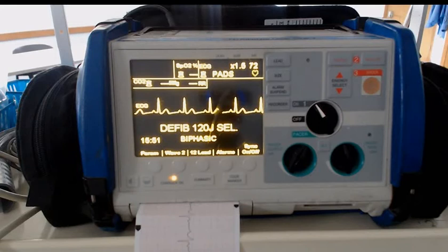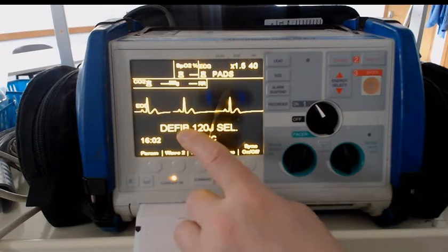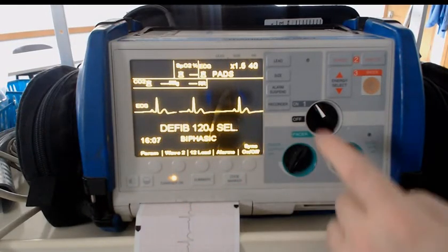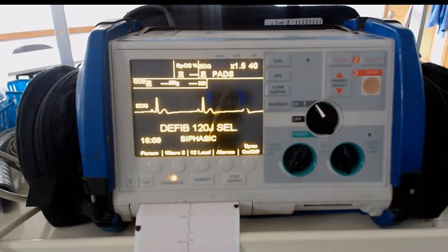As an EMT or an AEMT, you may find that you're on scene and you see a couple of other rhythms that are still interpretable. First, you may notice that the rhythm is very, very slow. It is still a sinus rhythm because we can see a P wave in front of every QRS, but it's very slow. In fact, we have a rate of 40 on this patient. A patient like this may have complained of having passed out or feeling like they're going to pass out. They might feel nauseous, they might feel weak, and there are people who are asymptomatic at this kind of bradycardia.